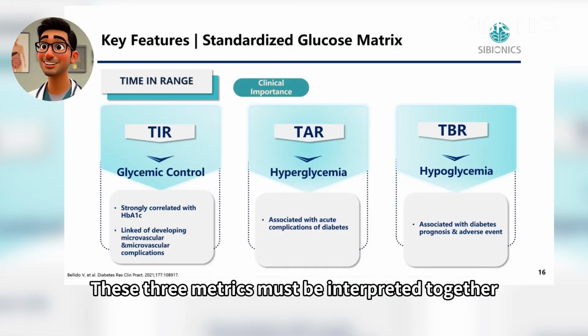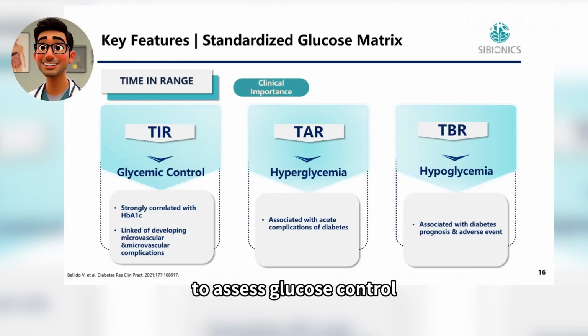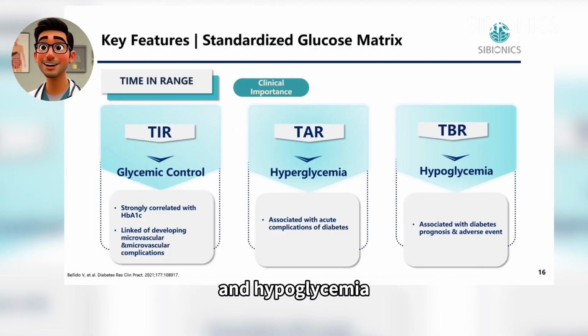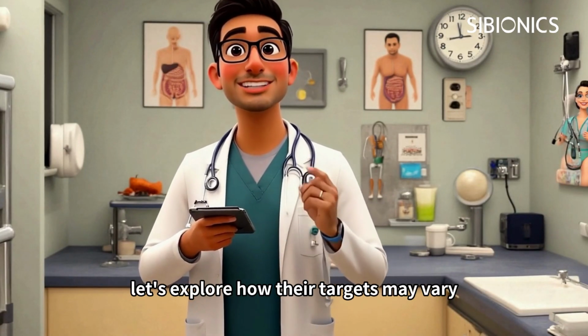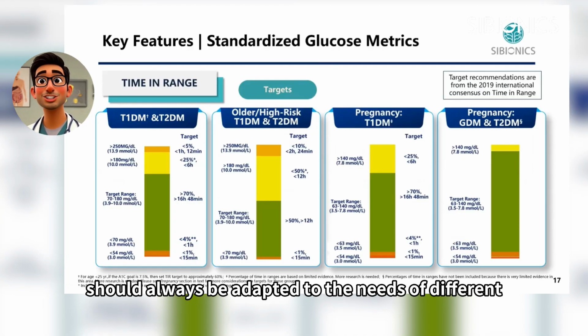These three metrics must be interpreted together. Relying on TIR alone is not enough to assess glucose control. TAR and TBR help identify risks of hyperglycemia and hypoglycemia, which are critical for treatment decisions. Now that we have learned how to interpret these metrics, let's explore how their targets may vary depending on different patient populations. Glucose targets should always be adapted to the needs of different individuals.